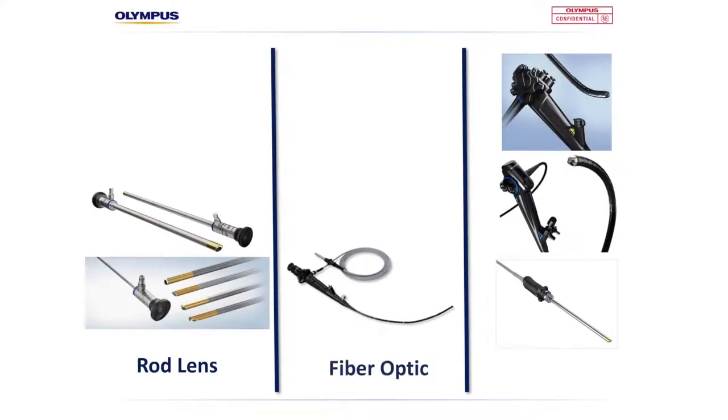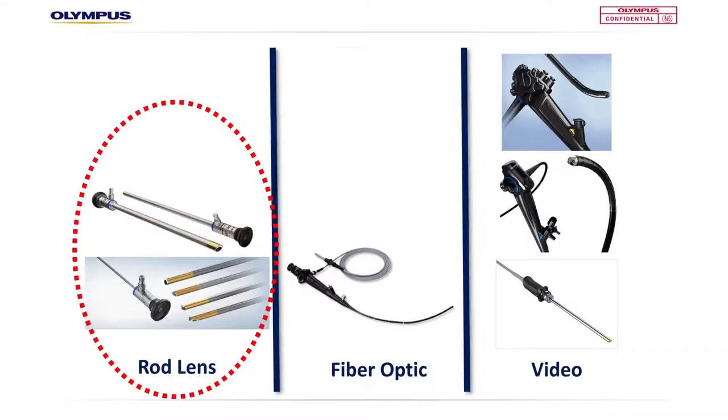For the past 10 or so years, I've been working in the hospital and OR environment, and so I've seen a lot of different types of scopes to be used. I understand that all of these different types of scopes can definitely be a bit confusing. So this video is designed to try and help simplify the many different types of scope by categorising them into one of 3 types. The 3 categories of scopes that we'll discuss in this video will be rod lens, fibre optic and video scope. Let's start first with the rod lens telescope.